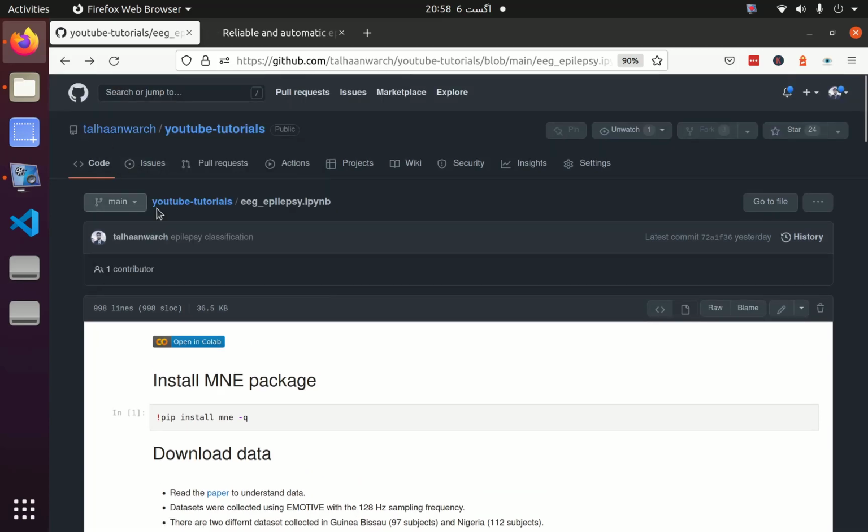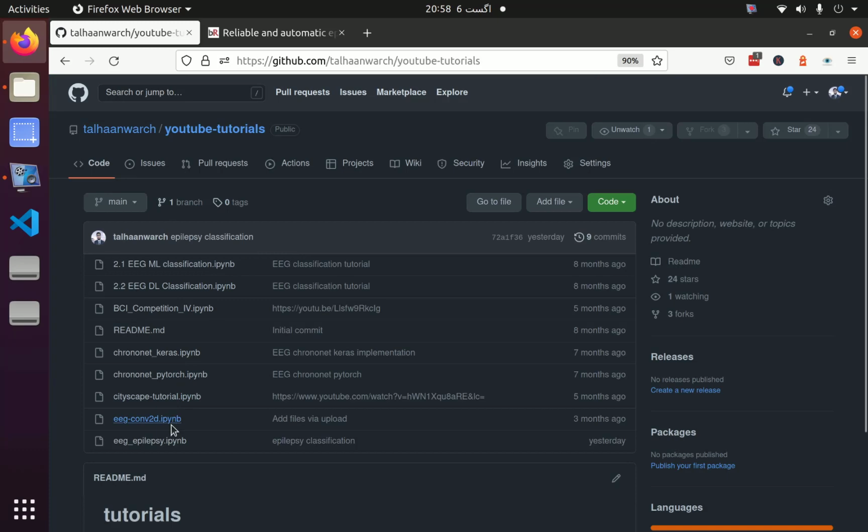In the GitHub repository you have to go to this YouTube tutorial repository and then you can find all of the previous notebooks and this notebook.